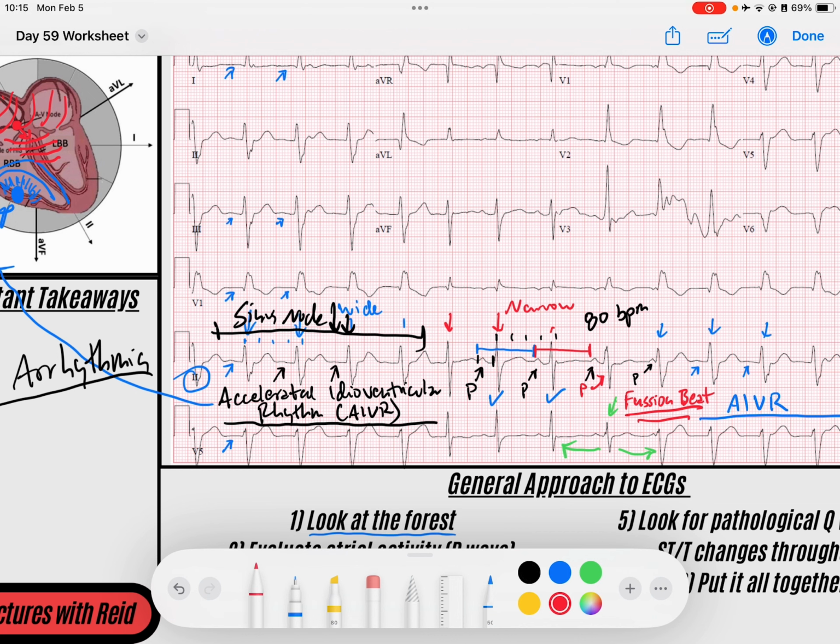And then you see the sinus node here in red picks up its speed. And so here we get an increase in the sinus rate, in the SA node rate. And because of that, we see that it can overcome and start to capture the atria, and then through the AV node capture the ventricles, because the rate here between these narrow beats is a little bit faster than the rate between these wide beats.